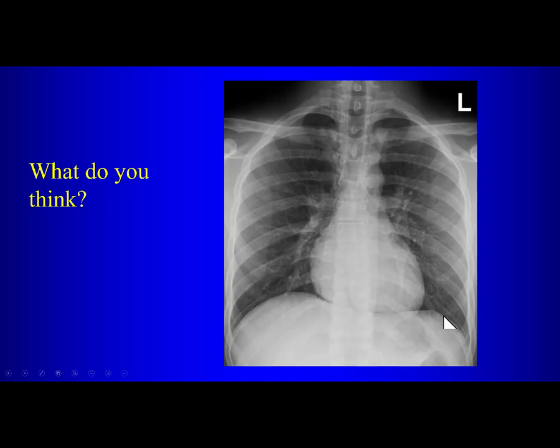This is a particular sign. What's it called? The continuous diaphragm sign, right? Usually you don't see the diaphragm like this all the way underneath the heart. So there are three causes of a continuous diaphragm sign. What are the three causes?